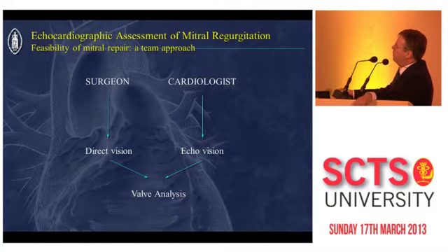That's an old slide. Initially, the surgeon has his direct vision, and we were thought to have the echo vision, which was quite different from the direct vision, but this is completely changed with 3D echo, and I will show you a lot of examples of 3D echo because I think this is the way to go today. And this leads to a similar valve analysis.